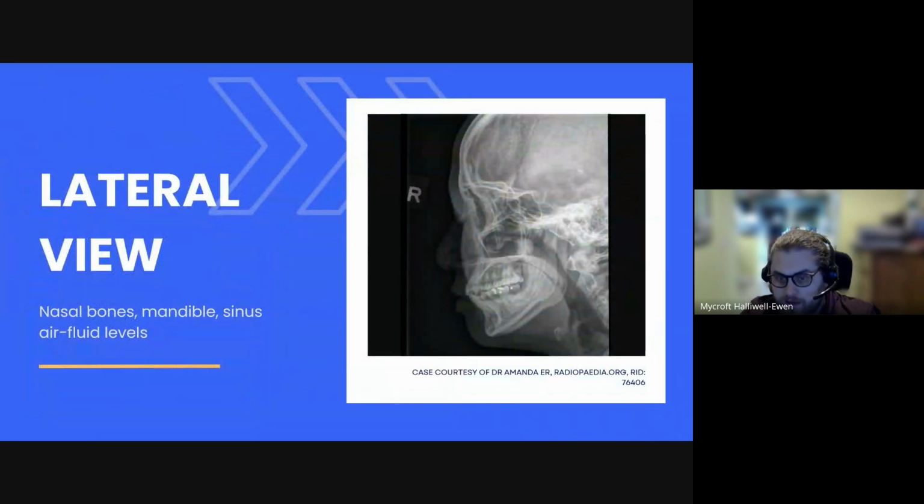Laterals. This is a really good place to think about some anatomy. Face and airway anatomy is really good, and you've got a really lovely shadow here of the person's face. It's a really high quality image. Okay, so hyoid bone, where all the strap muscles attach. We'll follow the mandible up into the TMJ. You can just about see this part of the nose is cartilage. This is the squishy bit, but then there's some cartilage doing that, and the skull really only starts here.